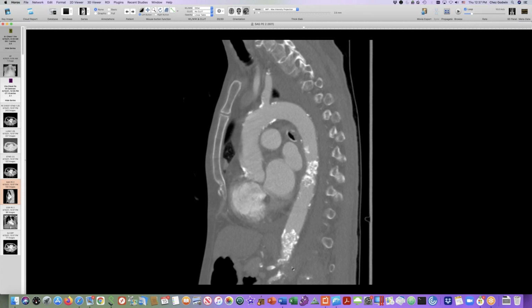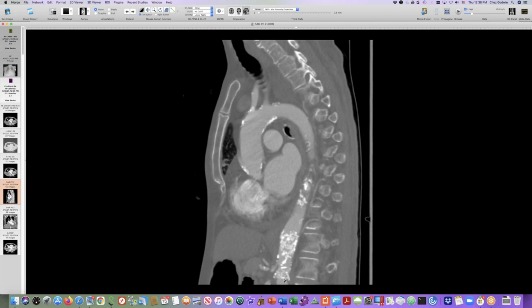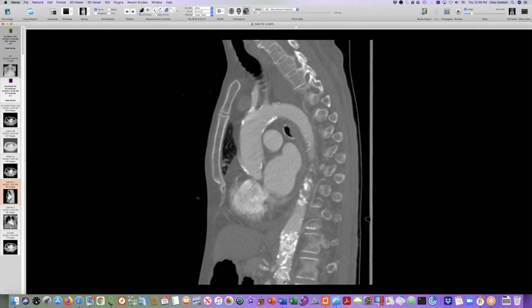No. Okay, so she's got atrial fibrillation. Another consideration is that sometimes people embolize chunks of their mitral annulus calcification. This stuff can embolize. I would expect to see bigger chunks and not small flecks like what we're seeing down here. And David, it's also unusual because it's not stuck to the wall. When you showed it in cross section, it was filling the whole lumen, and it's not distorting it. Right. And something's holding it in place.